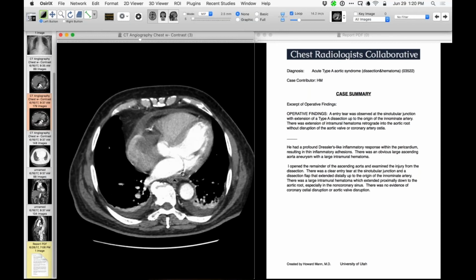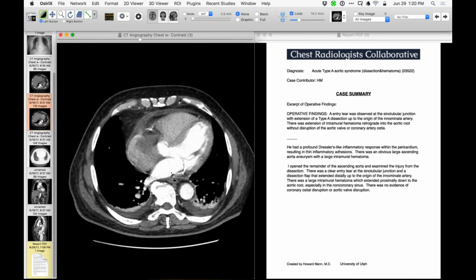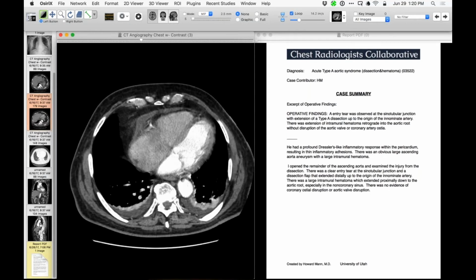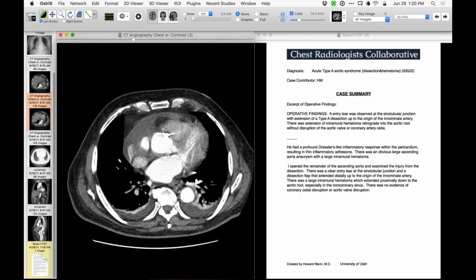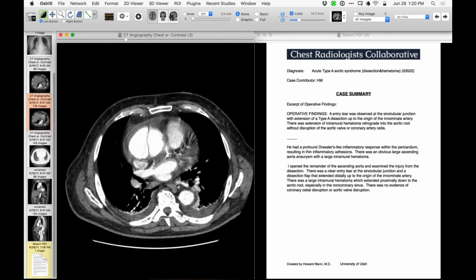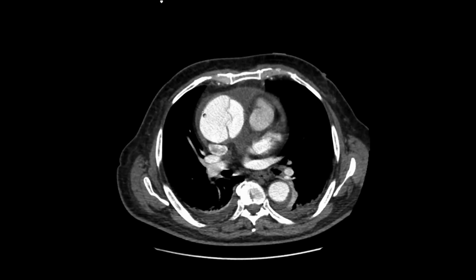Any thoughts about that case other than there seems to be a good anatomic correlation between what we see and the op report in general? Howard, doesn't it look like there's some thickening there if you come up along the aortic root, along the right lateral aspect, you know, like in that area. Are you looking, kind of, to the right?